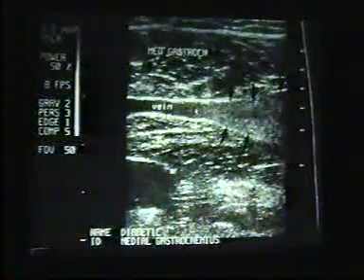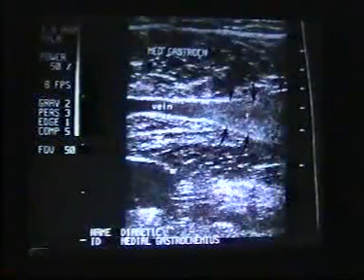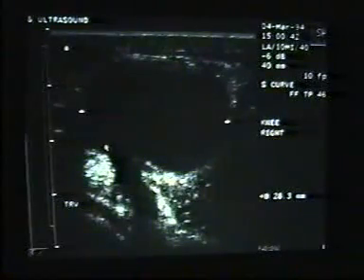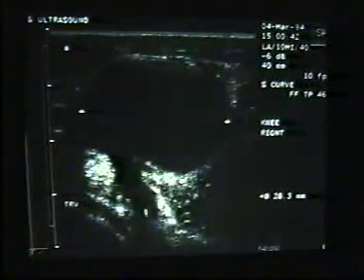And a cyst between tibia and talus, it is a ganglionic cyst in the foot near calcaneus. And here is vein with thrombus, DVT, in a patient with diabetes. And near the knee in the popliteal fossa we can find Baker cyst having continuity with the knee.